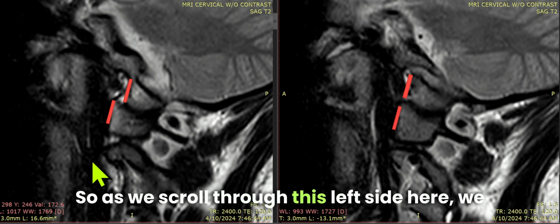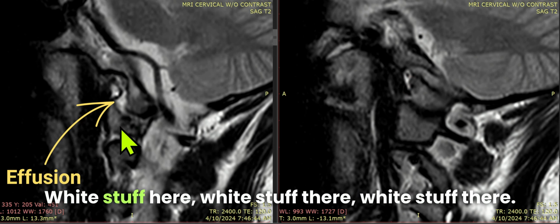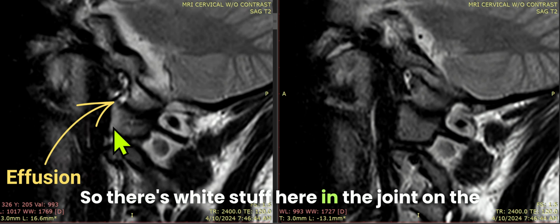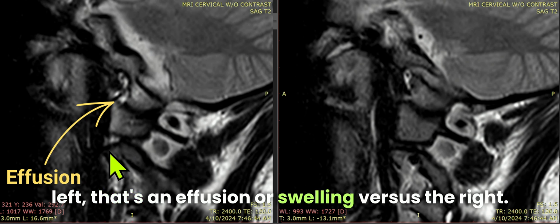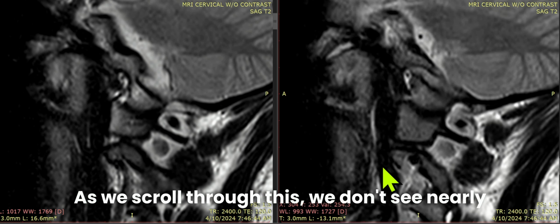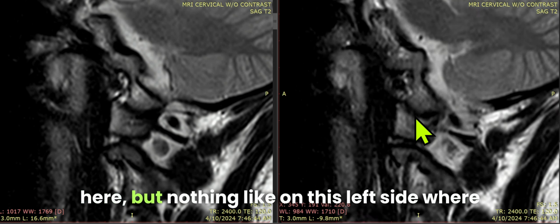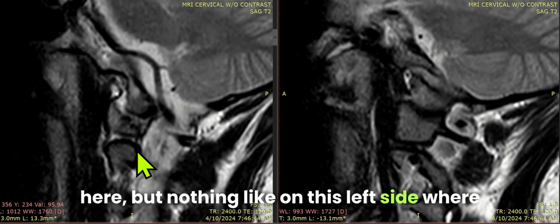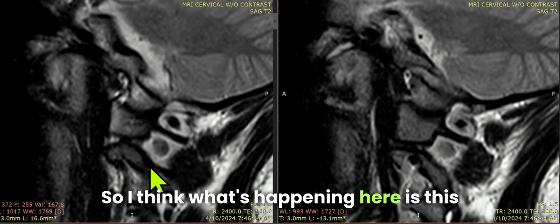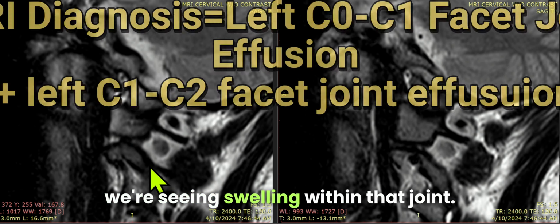So as we scroll through this left side here, we can see that there's a lot of this white stuff here, white stuff there, white stuff there. So there's white stuff here in the joint on the left. That's an effusion or swelling. Versus the right, as we scroll through this, we don't see nearly as much of that. Maybe it's a little bit here, but nothing like on this left side where we've got larger amounts of that white stuff. So I think what's happening here is this is a hypermobile patient. And on the left, we're seeing swelling within that joint.